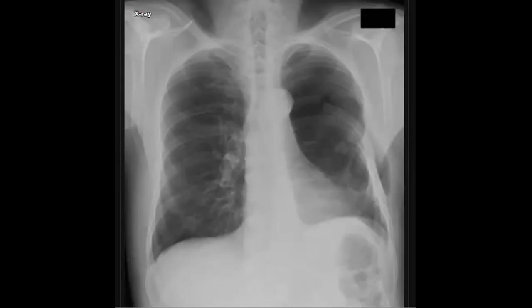And yes, you can see that there is pneumothorax. Perfect. So when you see a rib fracture, the important thing is to search for any related pneumothorax. Maybe he has a pneumothorax from the rib fracture, and also check for hematoma or hemothorax, a blunted costophrenic angle, or any pleural effusion.